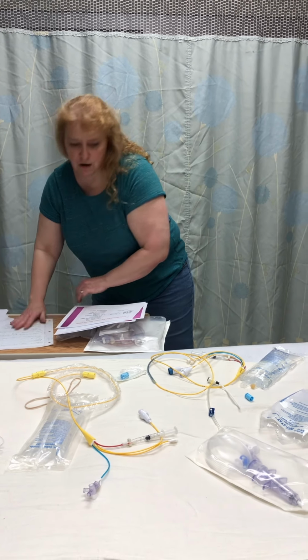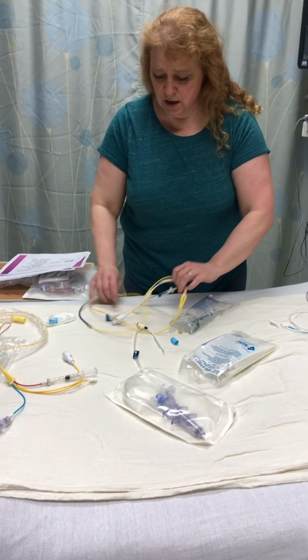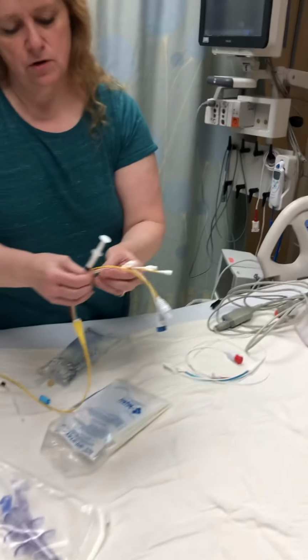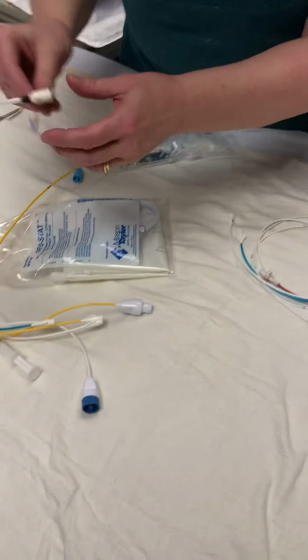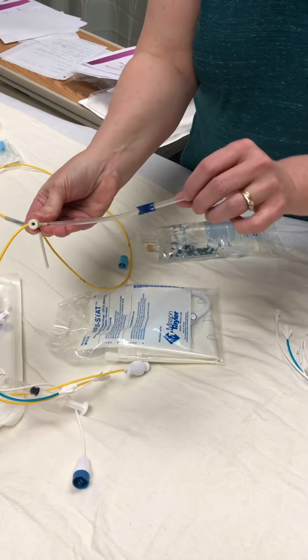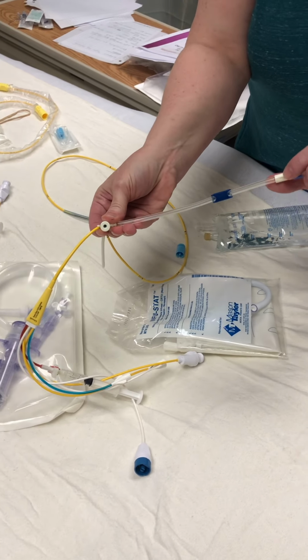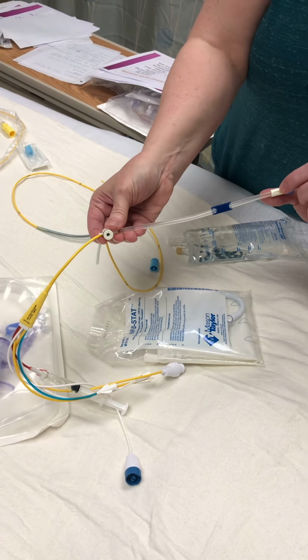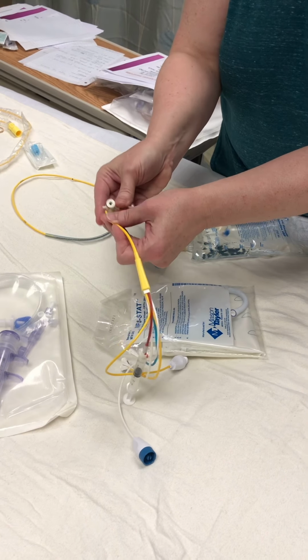Okay, so back to the different types of Swans. Our continuous cardiac output Swan, when you take a look, I'm going to go through these different ports. So you've got a couple of different ports here. Like I said, this is going to be threaded through the introducer, so you always have this port as a line. In our open heart population, what we do is we have a maintenance fluid along with our cardene, our antihypertensives, so in the open heart population.